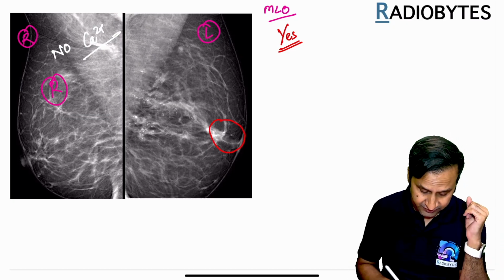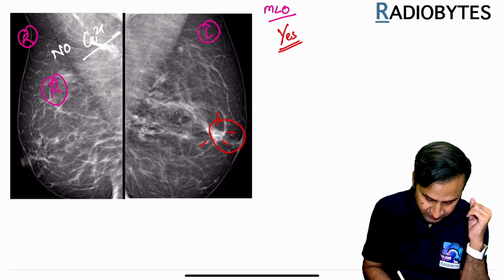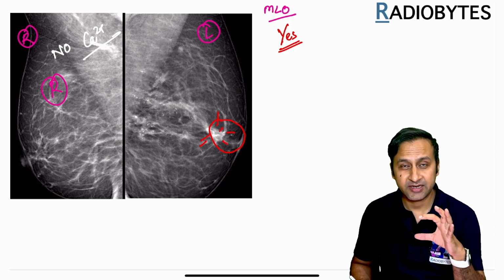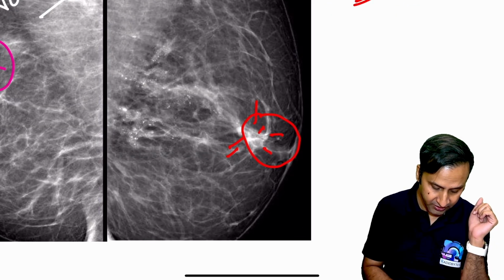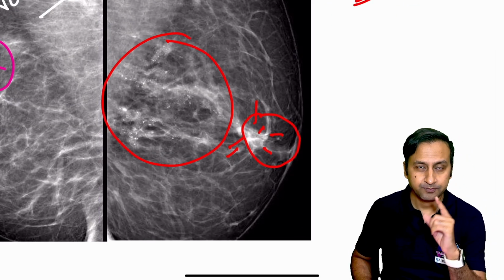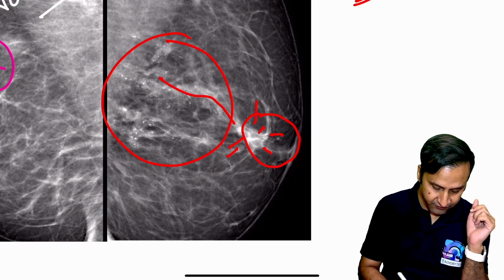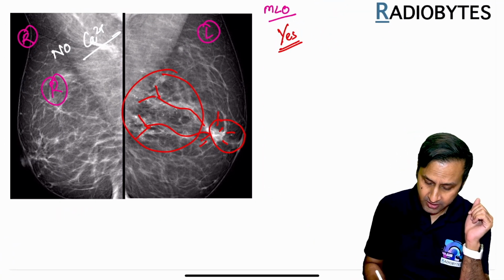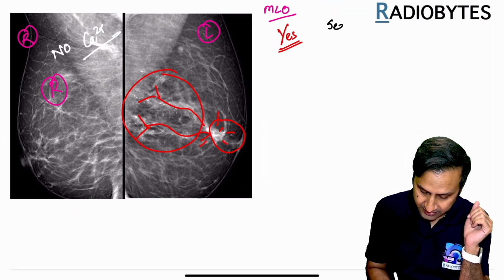One more suspicious thing is this particular lesion that I see in the breast. So I do have a lesion in the breast, and on top of that lesion, I'm now looking at calcifications which are unilateral, number one, and they look as if they are extending in a ductal fashion. I can call it a segmental fashion. So this is a segmental calcification.